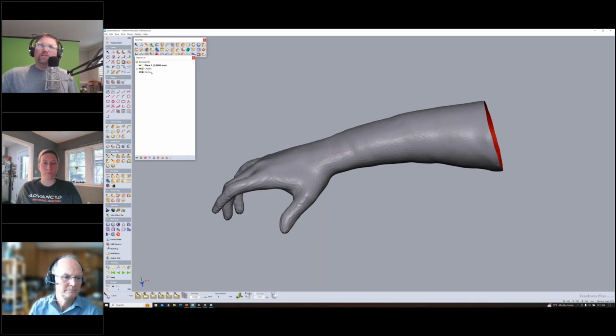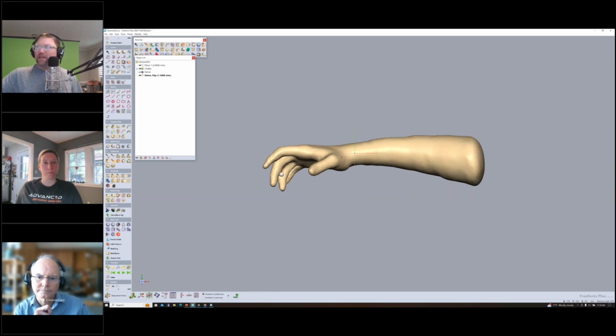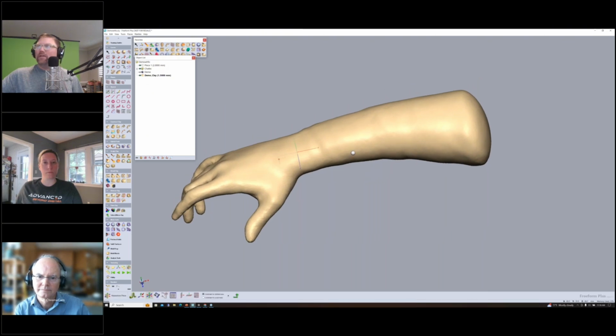So what we do, once we have a mesh, we move out of the mesh and into what is called voxel modeling. And so voxels, think of it as a piece of sand. And I am using sand, if you look down in the bottom left-hand corner, that is essentially a 1.5 millimeter by 1.5 millimeter by 1.5. So fairly coarse sand. But you can see that that already took some of that triangulation away, and we've got something smooth.